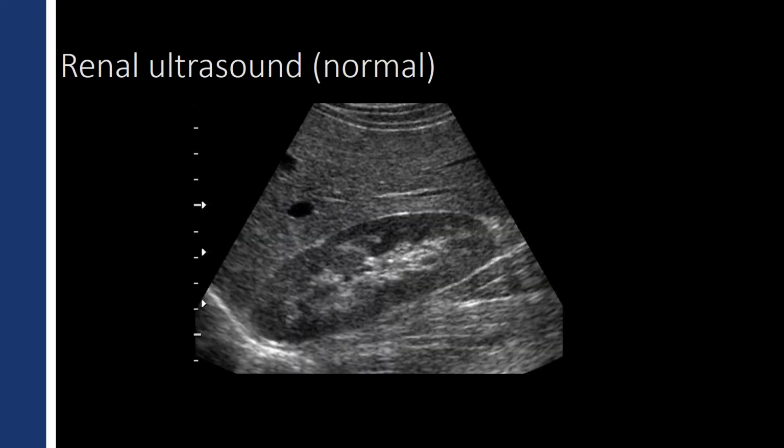All right, here's a very nice ultrasound appearance of the kidney. The kidney is one of the more distinctive things that we see on ultrasound of the abdomen. This happens to be the right kidney. How do I know that? Because I see the liver running right over the top of the kidney. Now, the kidney has this very characteristic ovoid or sort of a bean-shaped appearance, and on the outside is the renal cortex. The renal cortex is dark. It should be probably a little bit darker than the liver.